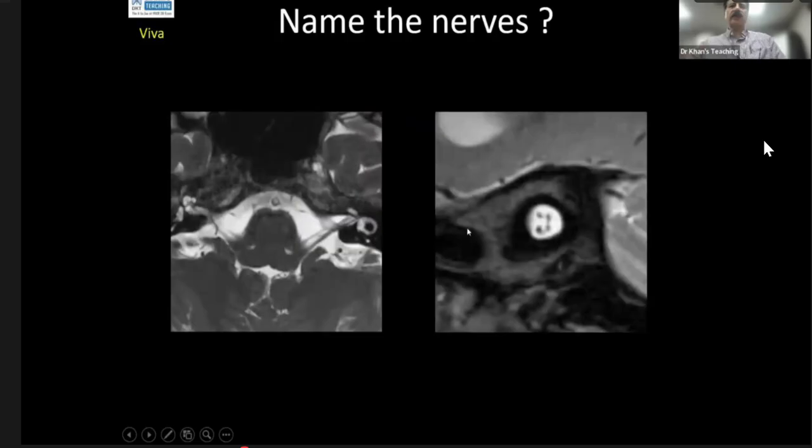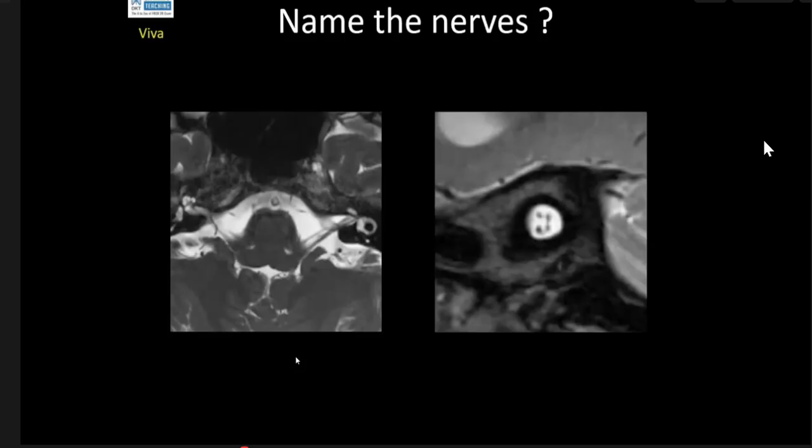So candidate 2, name this nerve. You can't unmute, okay? Let me help you. Yeah, so that's the facial nerve. Right.